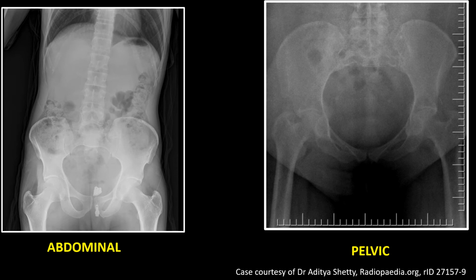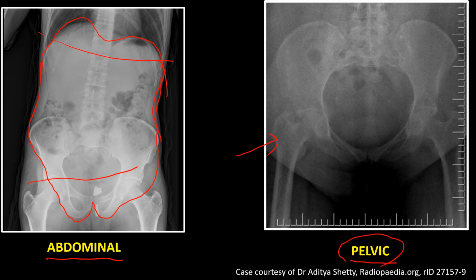In abdominal X-ray, the diaphragm, lateral wall of the abdomen, and pubic symphysis should be visible. But as the abdomen is quite a large area, a single X-ray film may not cover the whole abdominal region. In that case, according to the investigating area, films are taken where some lower part or upper part may be left out. As you can see here, we can see the whole pelvic region. So this is the abdominal region and this is the pelvic region. The pelvic region is focused when our target organs are pelvic organs.